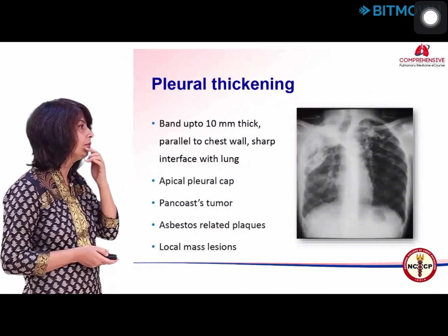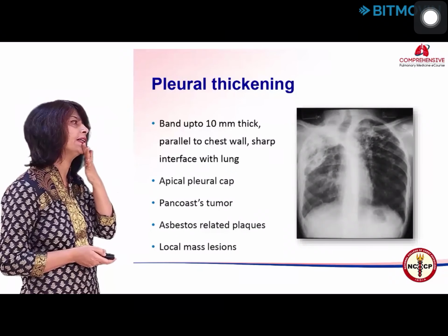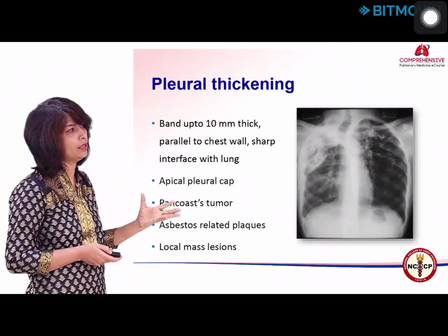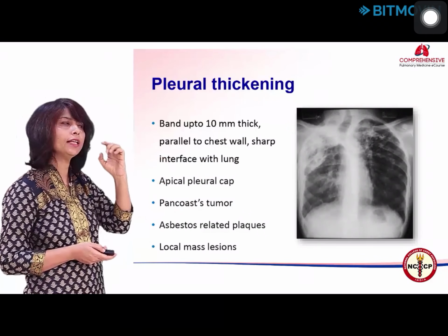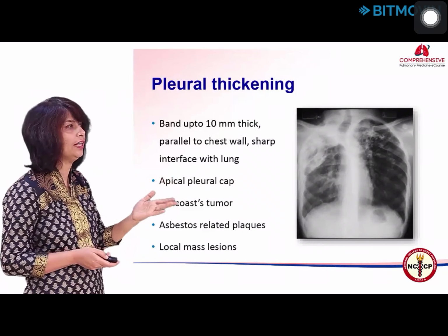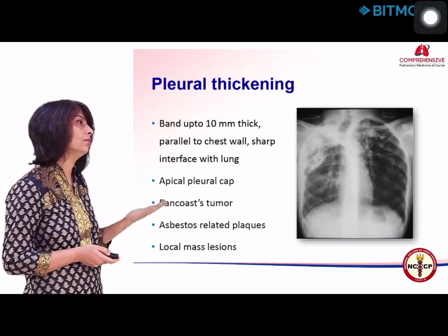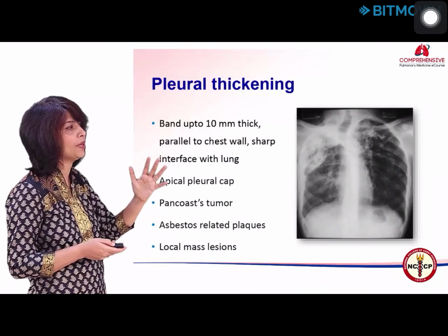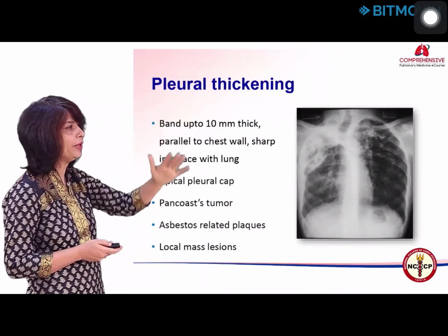Pleural thickening, basically what you need to remember is that if pleural thickening becomes more than a centimeter, causes erosion of the overlying ribs, then you suspect a malignancy. Otherwise, we see it most often in context of tuberculosis, and in this case you see what's happening to the ribs. In the apex, they are completely pulled down, what gives you the drooping shoulder clinically.